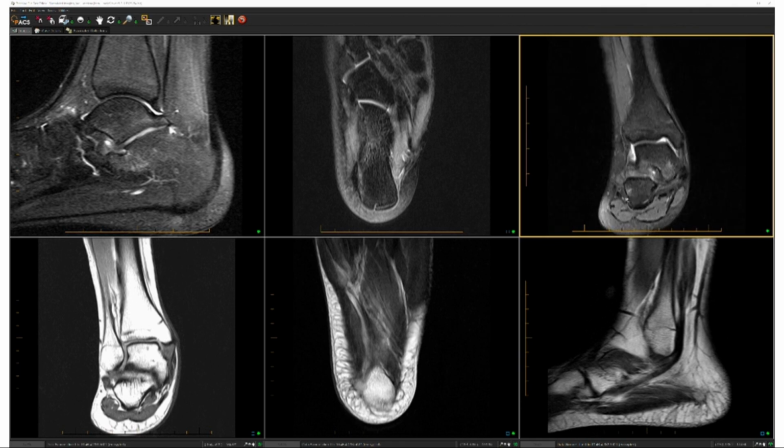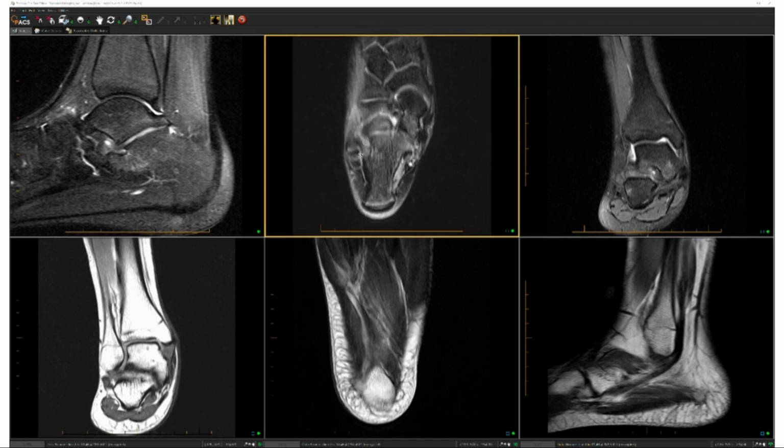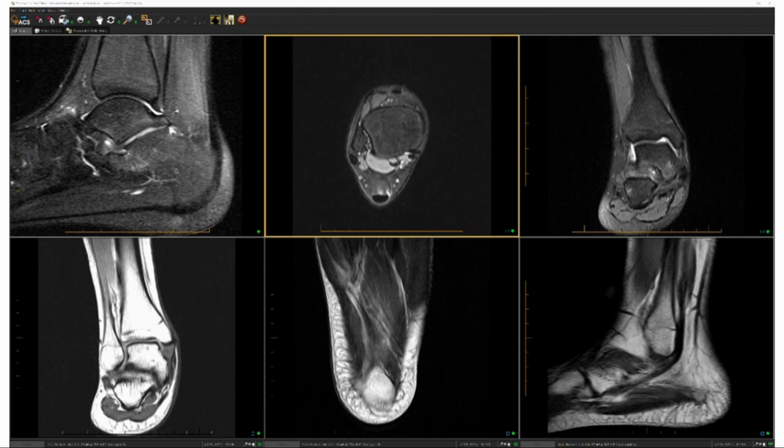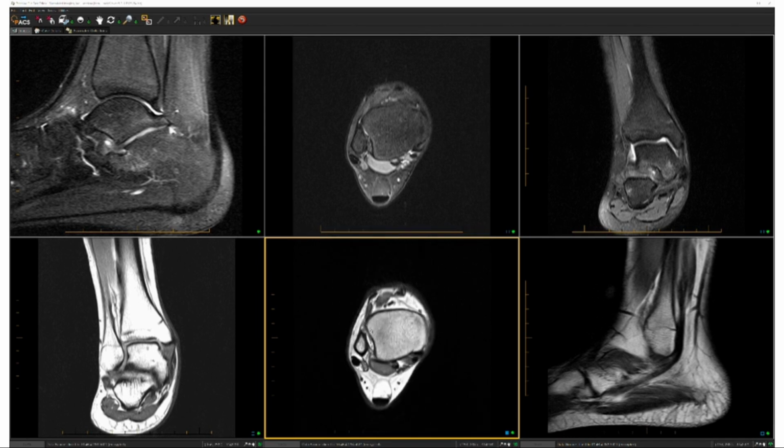I'm noticing that there is some kind of edema along the lateral calcaneal sidewall, and I'll come back to that on the bony structures, but that's in this region here. So while we're here, let's take a look at the lateral collateral ligament complex and examine. So now we're going to go over to the region of the syndesmosis, all clear on those. There's no inflammation. There's no widening. The interosseous ligament is intact.